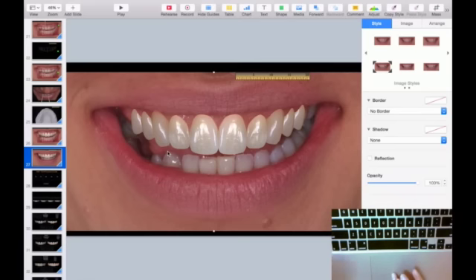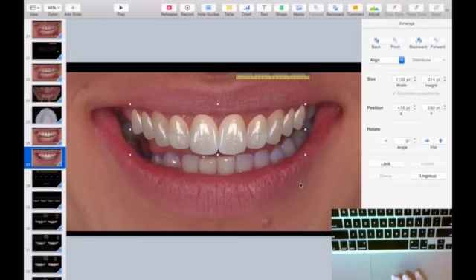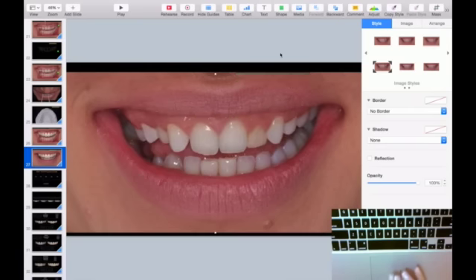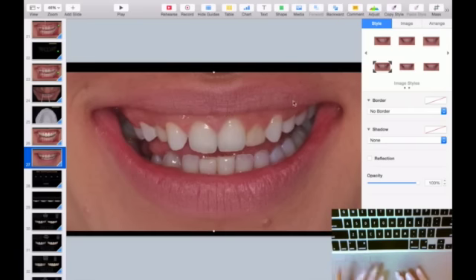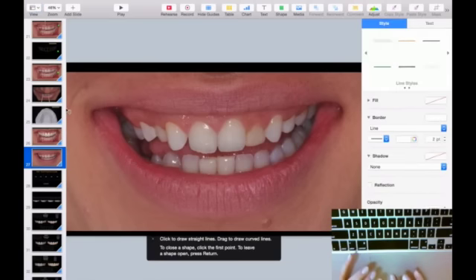So I gotta do the same process with my lip. Just so I don't forget this stuff there, I'm gonna get these little pieces and all my teeth, and I'm gonna group it. Now I have to duplicate my lip, so I'll get my lip here by doing the same thing. Draw with Pen, and now I just make sure I have the correct line of the lip.